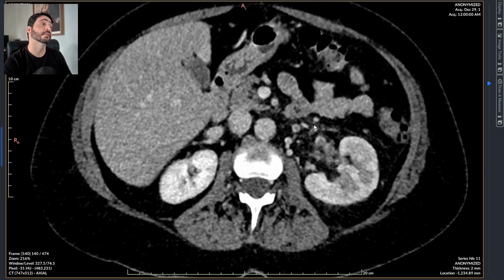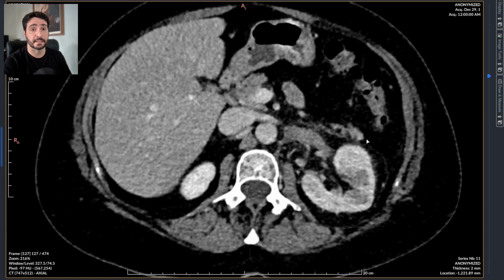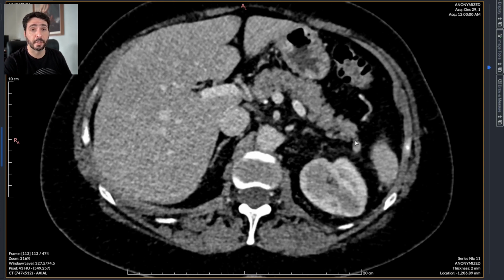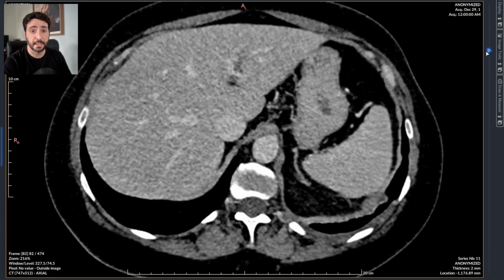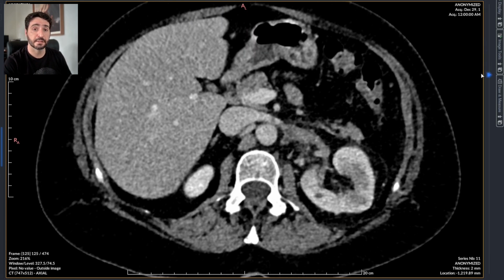This is one of the most serious vascular complications a kidney infection can lead to. So this is an acute vascular and infectious kidney. This is extremely serious. This patient might lose this kidney if this infection and this thrombosis isn't fixed, isn't addressed right away.